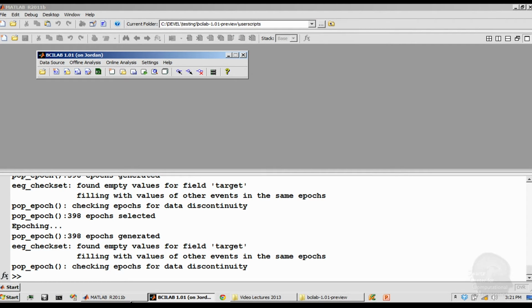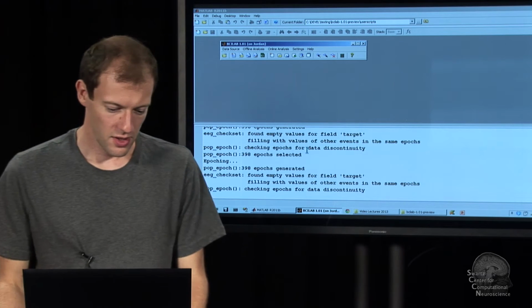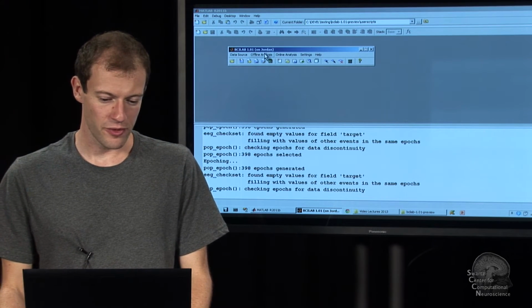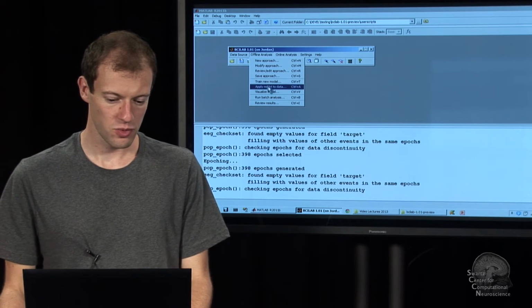So this works pretty well. This means this particular model on this particular task is wrong 5% of the time. The chance level here is, I think, 25%, because the person made an error on average 25% of the time. If you always say the person made no error, you're right 75% of the time. Anyway, we have a rather well-performing model. The next thing is to actually take a look at it and visualize it.